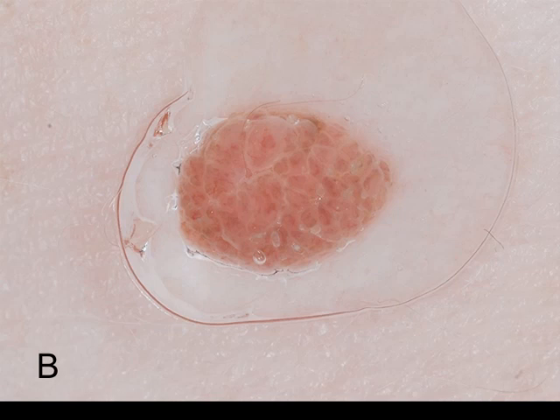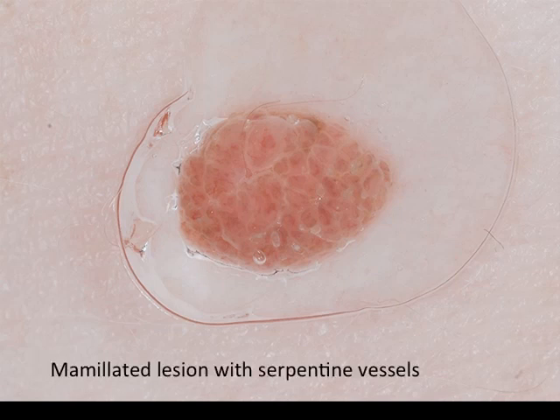Lesion B has a mammillated topography and is on the arm of a man in his early 20s. The lesion has been present for as long as he can remember. The lesion occasionally gets traumatized. What is your diagnosis? Dermoscopy reveals numerous serpentine vessels.